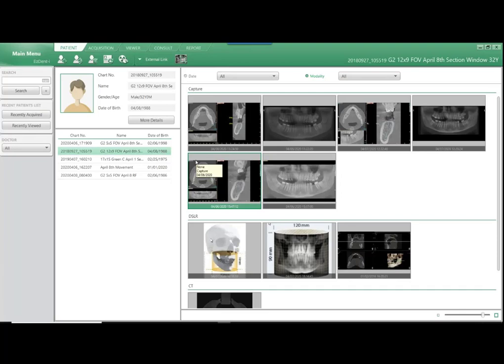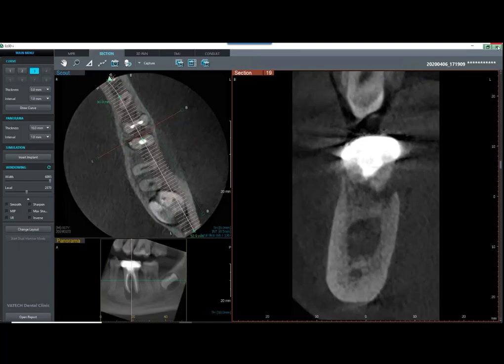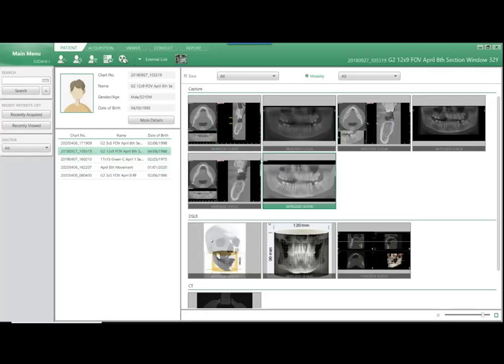So what's our next question on the list there? I can't remember if we addressed it in this session, but it's an important one. Is it necessary to draw the curve from left to right, clockwise, or counterclockwise? What's the correct thinking behind that?